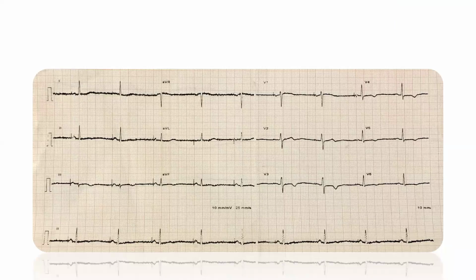I'd like to request Abdullah Al Mamun, sir. Sir, the ECG shows a rate of around 60 beats per minute. There are pacemaker spikes before each P wave in every complex, followed by a P wave and a normal QRS complex, with normal conduction. It's atrial pacing and ventricular sensing.